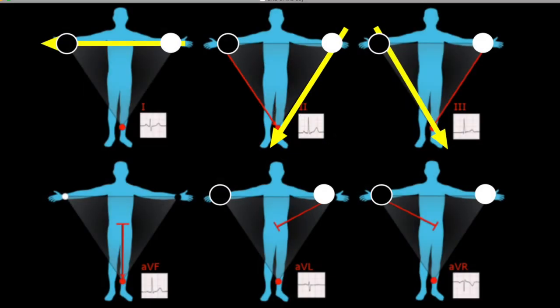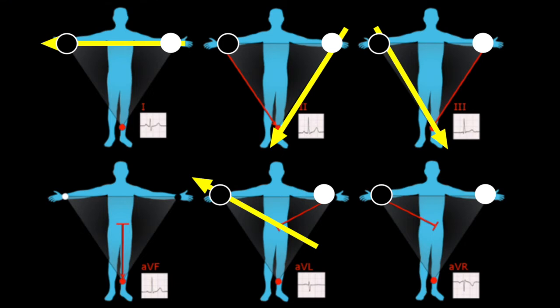So when you get these things, you notice lead 1 reverses direction. What is negative should be positive on the EKG if you misplace the limb leads. And then lead 2 and 3 ought to switch directions. Likewise, AVL and AVR ought to do a similar thing. They ought to switch places.